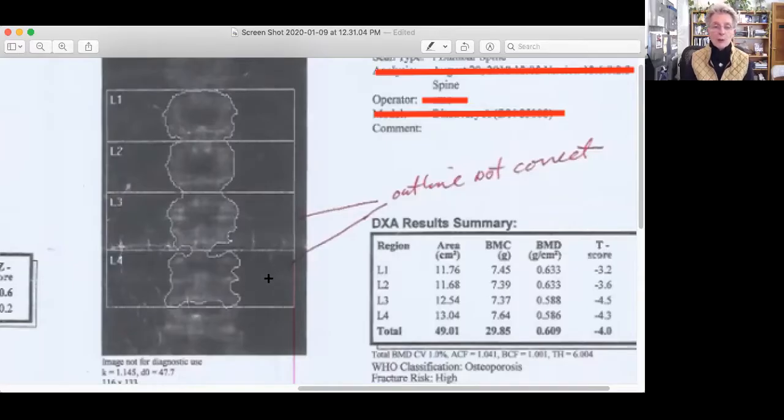How much difference would it make? I don't know, a couple percent maybe. Here's the thing: sometimes they don't choose the right lumbar vertebrae and all that, and I will show that in future episodes of these bone density errors, because what I'm really hoping is that I can start making some waves about this, because I think bone density is really important.